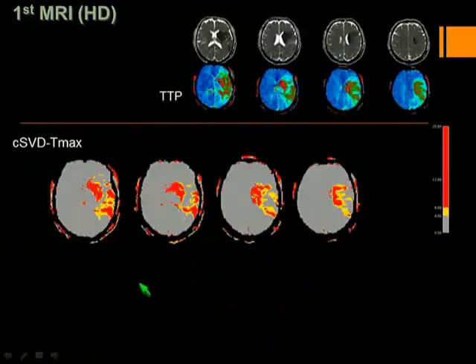Again, as Adam mentioned in his presentation, your Tmax, or time-to-maximum, maps are affected by SNR and MTT. So if you're doing a low-dose perfusion study, with low SNR and bad MTT, you're going to anticipate a bad Tmax, and this is reflected here.